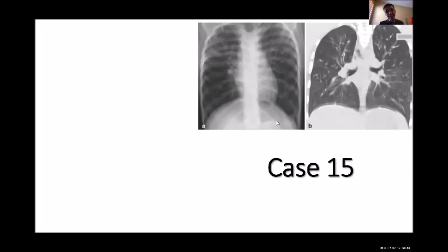I know it's cystic fibrosis because I put the sweat chloride test there. I don't want the diagnosis, I told you. You will fail in the exam, Lily and Rada.